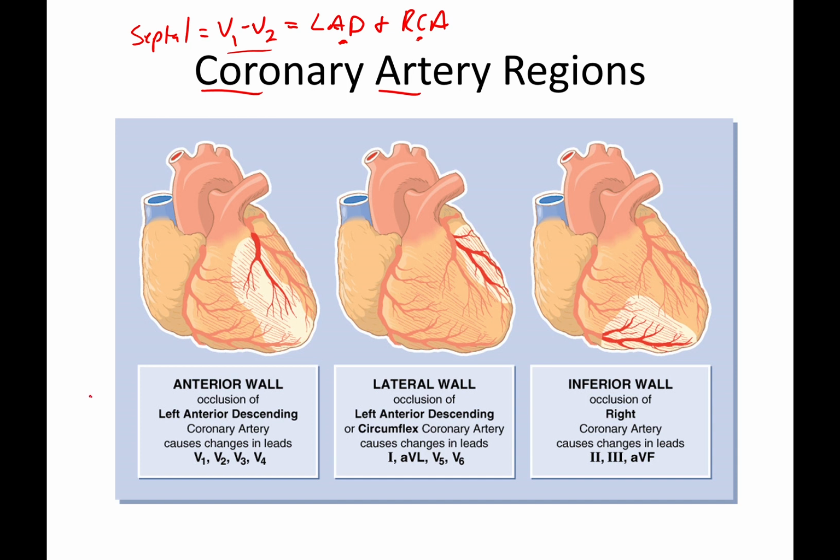The nice thing is that it will spill over into other areas, because let's take a look here at our anterior wall. I'm going to change our colors to this. So if I have changes in V1 through V4, all those cover this area right here. And so that's going to be your LAD.